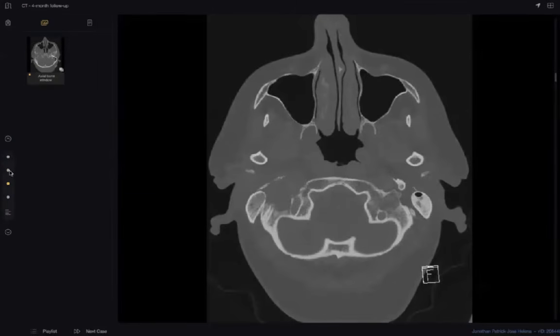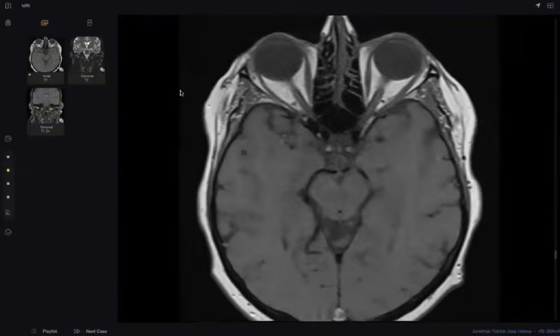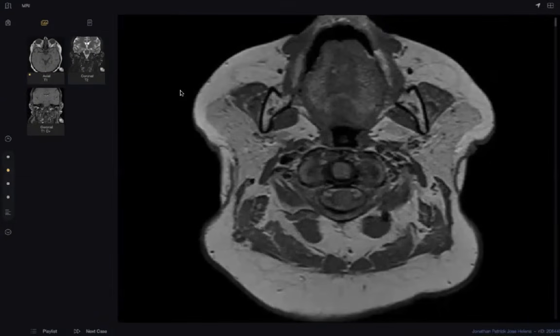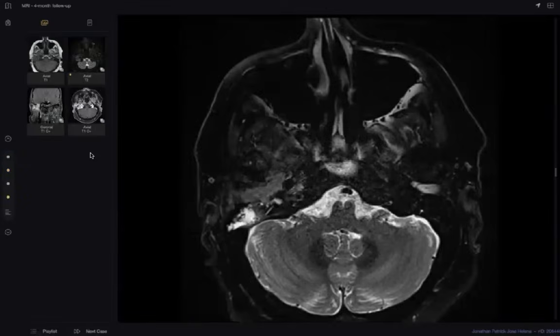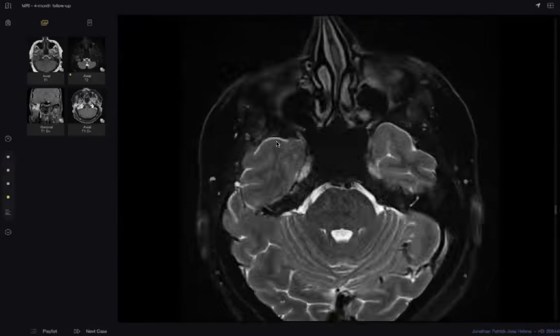Yeah, I'm more convinced it's a malignant mass invading the skull base and maybe extending into the brain. Yes. So yes, this is MRI of the brain T1. You previously commented on it. I think they did another MRI after 4 months. What do you think?